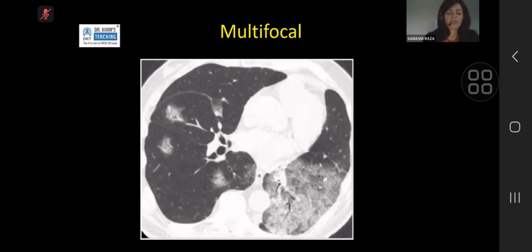It can look like infection. It can look like multifocal infection. It can look like organizing pneumonia. So in this one, you see the left lower lobe is extensively involved with extensive ground glass, even a bit that looks like septal thickening, and you see these foci of ground glass, and somebody reasonably may say that this is organizing pneumonia or an inflammatory etiology. Even in COVID, some might say, but this actually is multifocal adenocarcinoma.